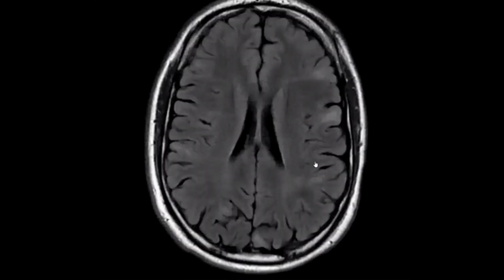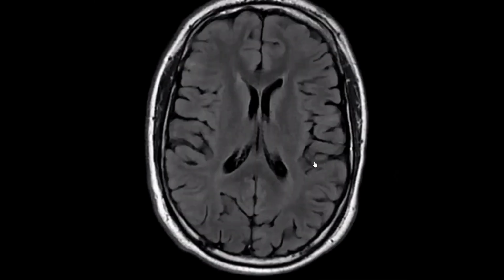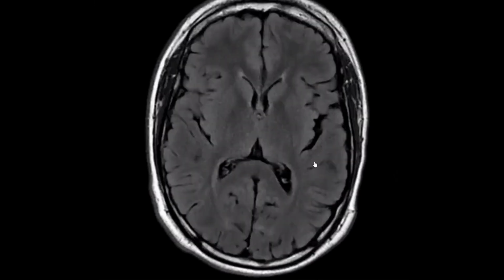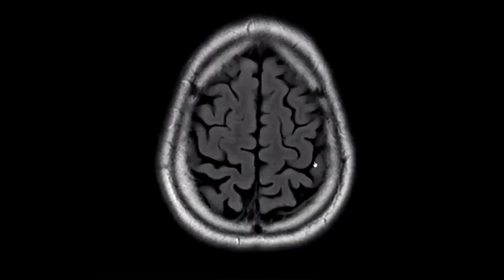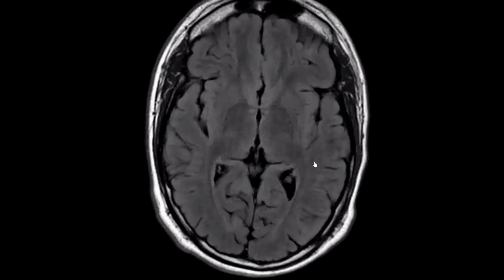I would like to add something. We don't have any really definite or logical differential diagnosis here in this case. It doesn't look like MS or encephalitis or something like this. I think it is very pathognomonic for tuberous sclerosis. What do you think? I would like to read the chat.